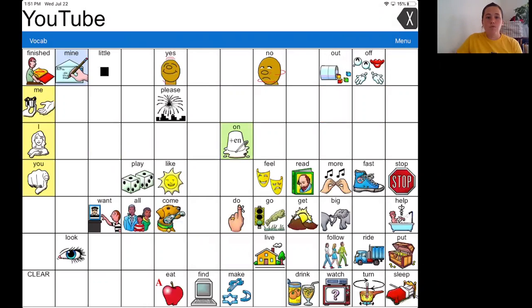So I hope that helped you learn how to add a new word into the LAMP Words for Life system. Remember, we try not to overload the system and make it stuff that's really functional for your child and is going to be really meaningful. Right now, during this time of remote learning, I know YouTube is a really functional thing for your kids. So I want to make sure it's something they can access.